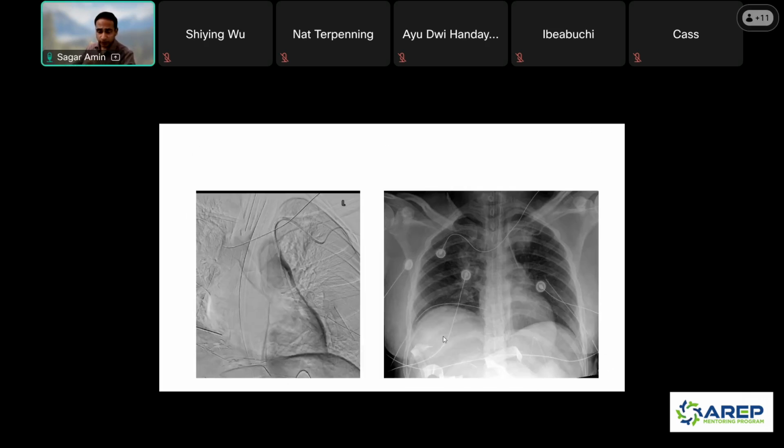So they were actually, I think they were embolizing, or IR was doing something in the abdomen. They saw where the line was placed, and so they injected some contrast to confirm that it was in the pleural space and not to be used. So you can see the contrast here on these images, and then the original location of the line overlying and correlating with these pleural images.